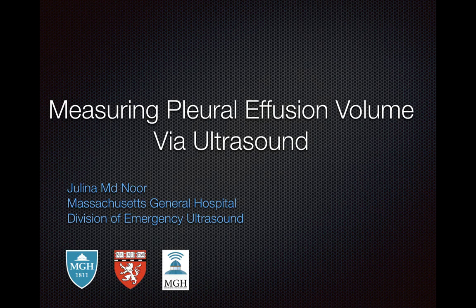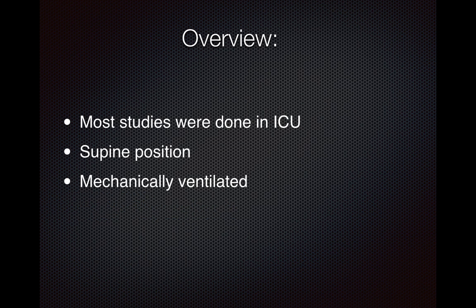This tutorial will briefly describe how to estimate pleural effusion volumes using ultrasound. The current literature describing how to estimate pleural effusion volumes has been performed in patients in the ICU who were in the supine position and mechanically ventilated. However, we can use the same measurements and calculations to estimate pleural effusions in any patient.